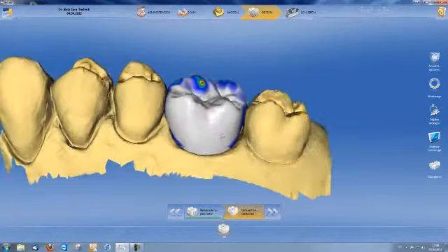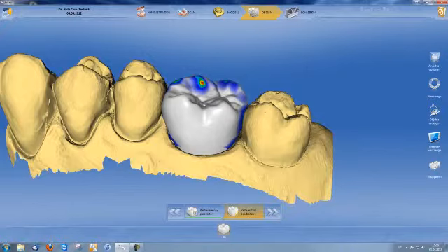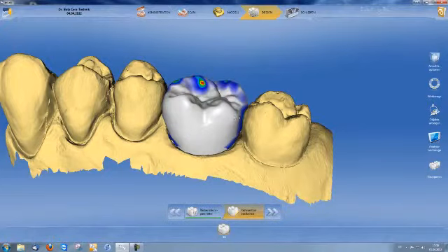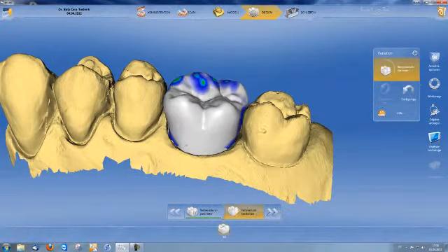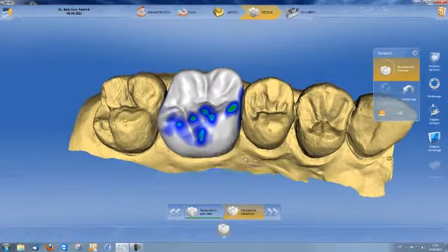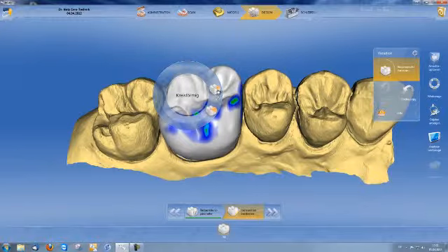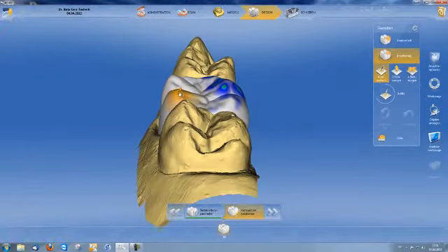I can then design my crown anatomically, and I activate my tool wheel. Here, I have the option of changing the anatomy again via biogeneric variation. I can move the controller to achieve the desired anatomy. Right-click, Shape Tool, Circular. I can now position my buccal cusps.